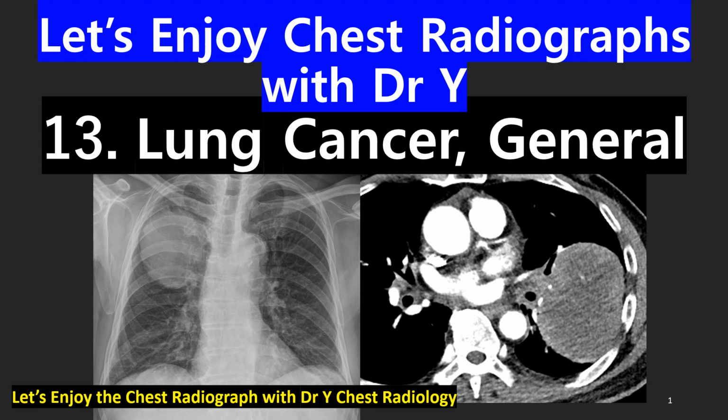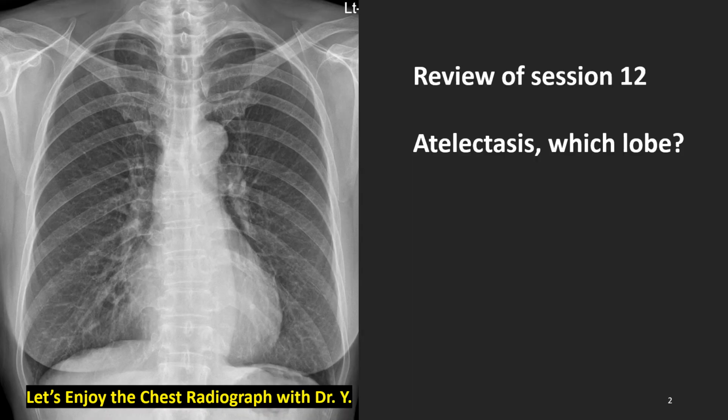Today's topic will be lung cancer in general, session 13. Let's review session 12 about lobar atelectasis. Which lobe is involved in atelectasis in this frontal radiograph? Yes, correct. It's the right middle lobe.